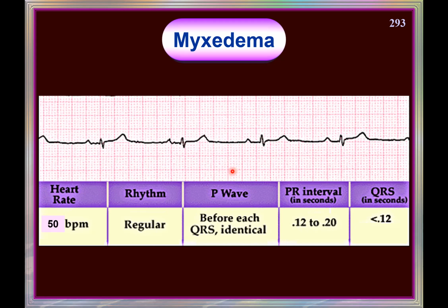What is the heart rate here? This is a P complex: 300, 150, 100, 75, 60, 50. So maybe less than 60, a little more than 50, maybe around 56 or something. Working it out here, it is around 50. 300, 150, 100, 75, 60, 50. Looking at these things, it looks like 50. So around 50 beats is the heart rate.